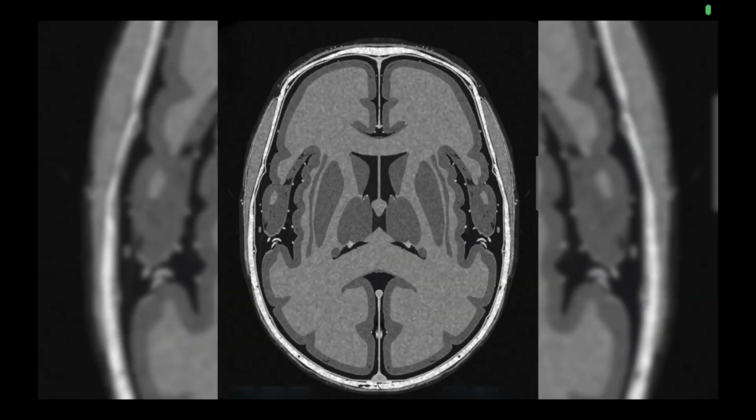So how do we identify the right and left sides? Now coming to the most important part, the right and the left. Remember that the CT scan image usually displays as if we are looking at the patient from the patient's feet towards the head. Therefore, the patient's right side appears on the left side of our screen and the patient's left side appears on the right side of our screen. This is a very common point of confusion for beginners.